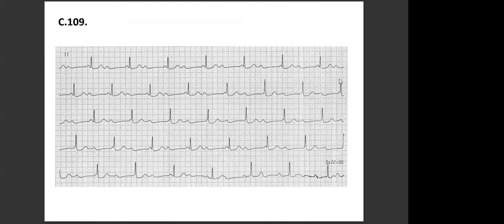This is only one lead, lead number 2, all the way. From the first look, I can say it's a bradycardia because the R distance is longer than usual, about 40 beats per minute. And you can say that it is second degree 2 to 1 heart block because... No.